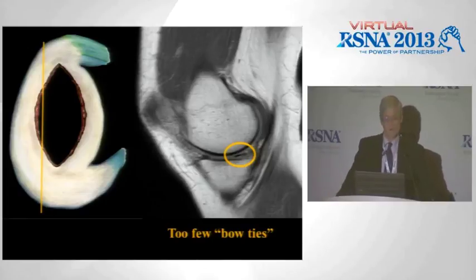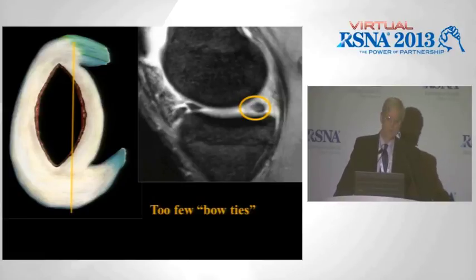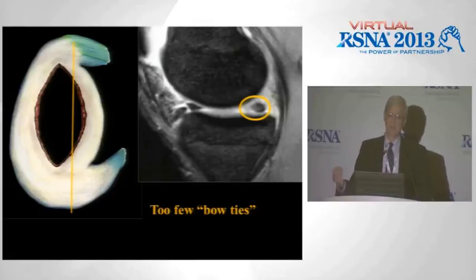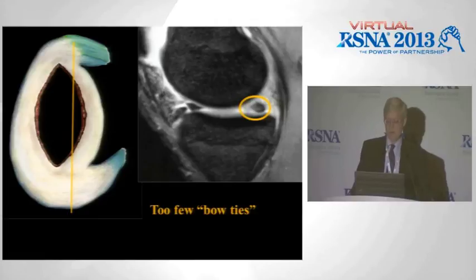As you march more and more toward the intercondylar region, you will see more deformity because you've lost meniscal volume. This is really a vertical longitudinal tear, but now it's displaced into the intercondylar notch. As we get more and more toward that inter region, we will see blunting of that posterior horn, but now also the anatomy is important because it looks like the anterior horn is way too big. So we have to understand, normally on the medial side, the posterior horn should be bigger than the anterior horn. Where has that meniscal volume we've lost gone?